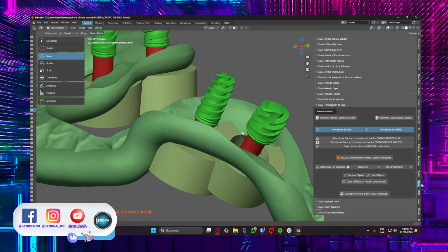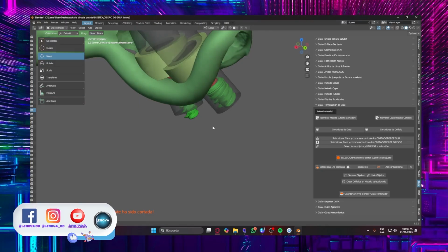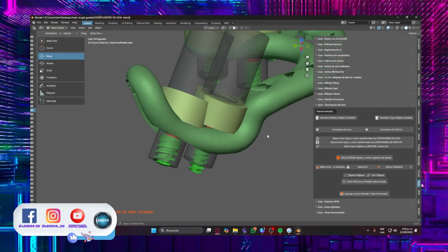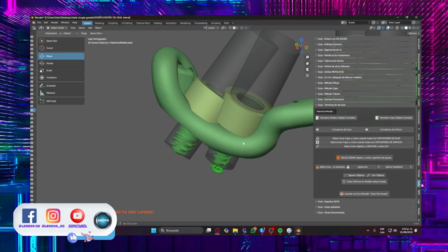Oh, something I did before doing that whole process was to configure the rings. We have to configure the rings both in the internal area, their path, and their external area, right? But as I was saying, we need to save material for the course in November. So what am I going to do here?